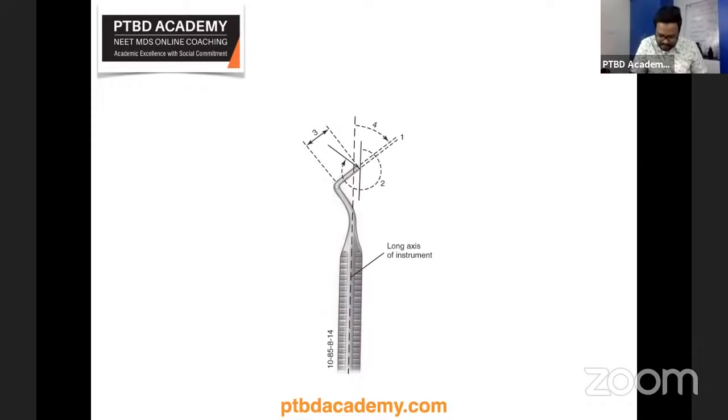And the 4th digit indicates the blade angle. So in this given formula, 10, 85, 8, and 14, now you know what each of these numbers represents: width of the blade in tenths of a millimeter, primary cutting edge angle, length of the blade in millimeters, and then blade angle. Very good. So you should not get confused. If it is a 3-digit formula, then the primary cutting edge angle is omitted. Very good.